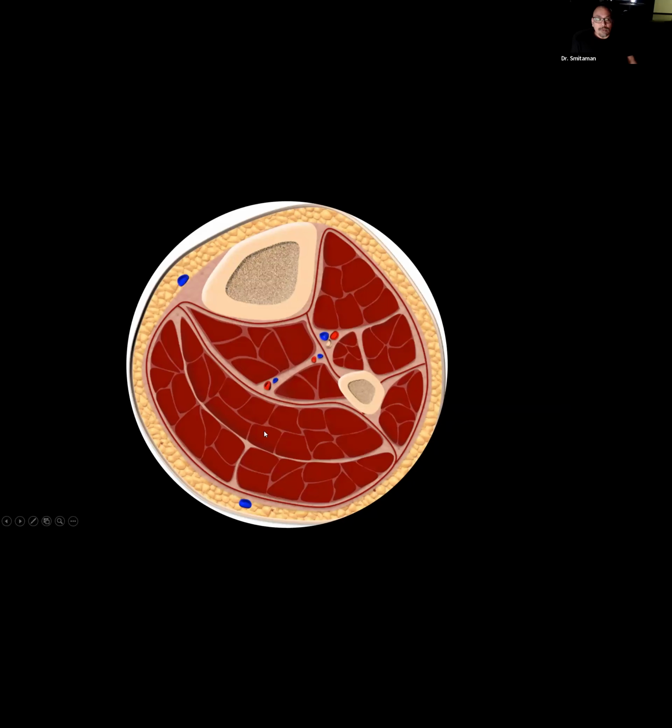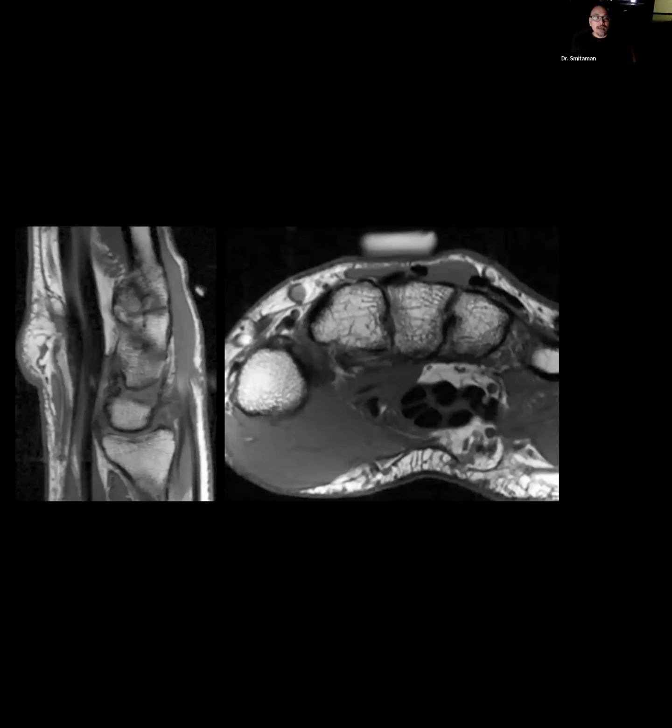So starting with the abnormal variant anatomy with normal signal, okay? Variations, as we know, in muscles can be caused by congenital factors, post-traumatic changes, fascial weakening, for instance muscle hernias, or even surgical procedures, muscle flaps, what have you. It can be challenging to recognize by MR imaging unless you know anatomy. Once you know normal anatomy, no one can touch you, okay? But basically on your T1 and T2 weighted sequences, it's just going to follow muscle signal.